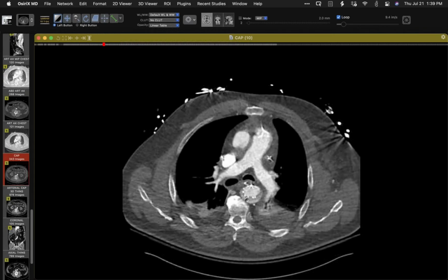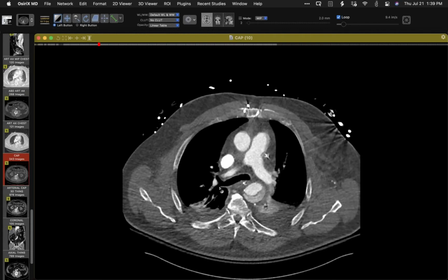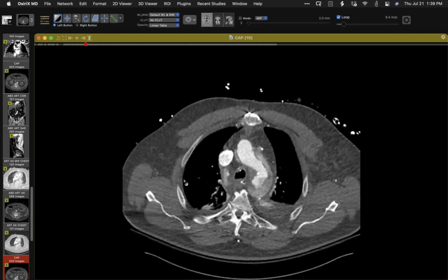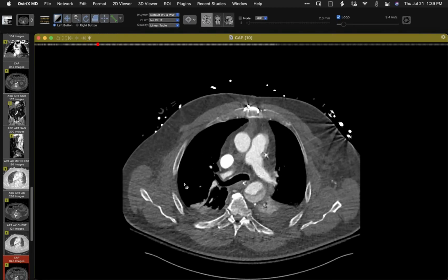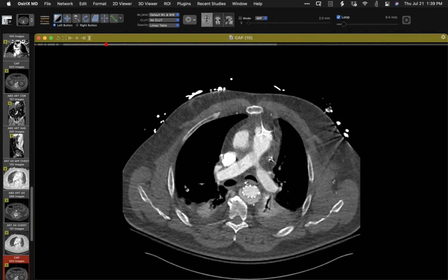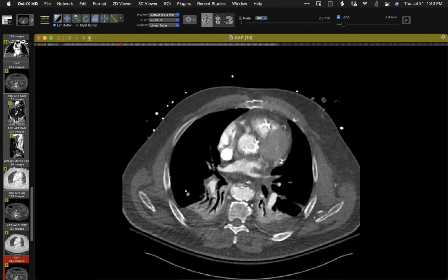Well, the septum here is not composed of muscular tissue. It's very thin. It's intima and a little bit of media. Right. So if you blow up a stent in that, you could easily disrupt that fragile membrane that's separating true and false lumen. So, just placing a stent puts that at risk. You can't really get this to fill out a lumen and have adequate counter resistance to it.